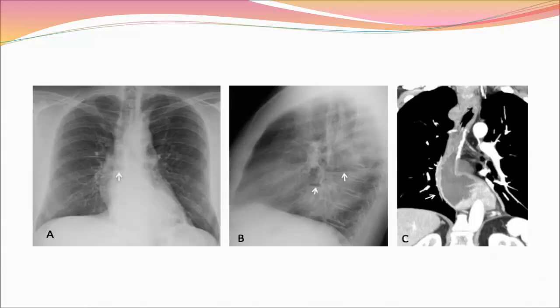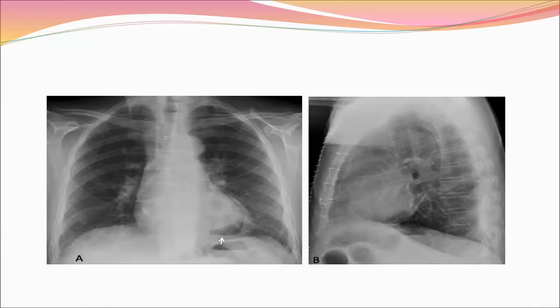Patient after resection of the lower esophagus and pulling up of the stomach, C, arrow, giving the air fluid levels apparent on chest radiographs, A and B, arrows. A 47-year-old man with pneumopericardium and an air fluid level after heart surgery visible in the PA view, arrow.